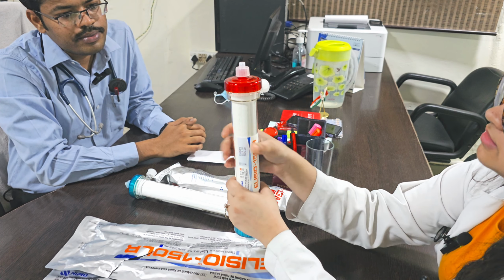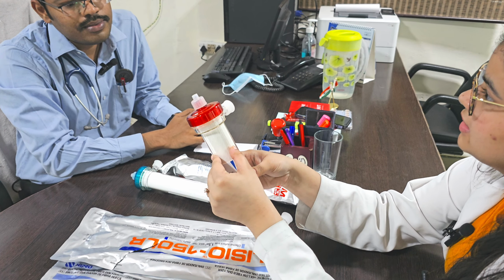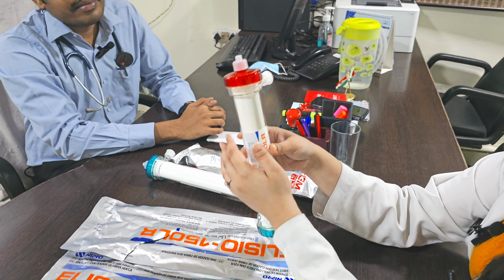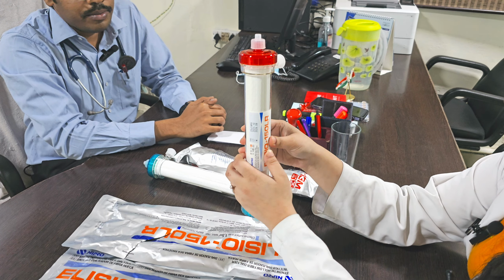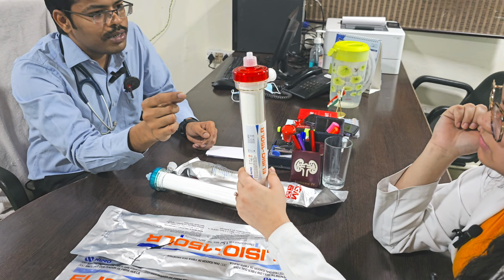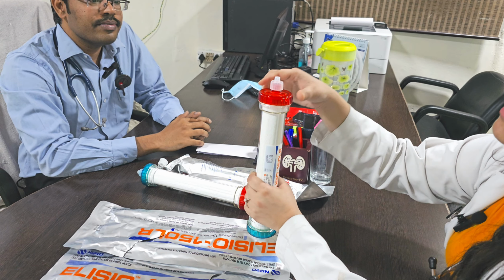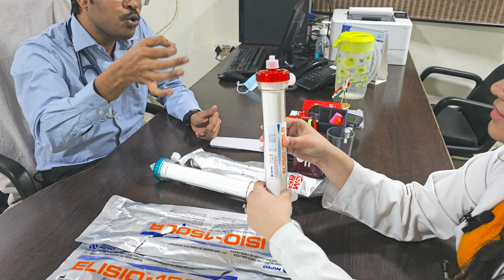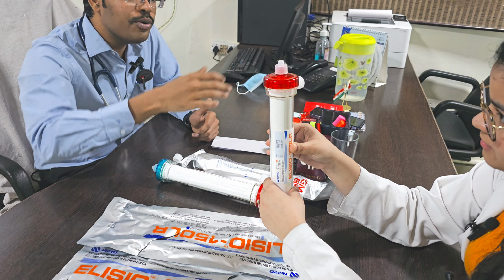Then, sir, inside there are micro capillaries also. Out of which two mechanisms happen: one is diffusion and one is convection. Primarily two mechanisms occur, diffusion and convection. Yes. And then there is a ring called the O-ring inside, which holds the microcapillaries. All the microcapillaries are kept in position because of the O-ring.